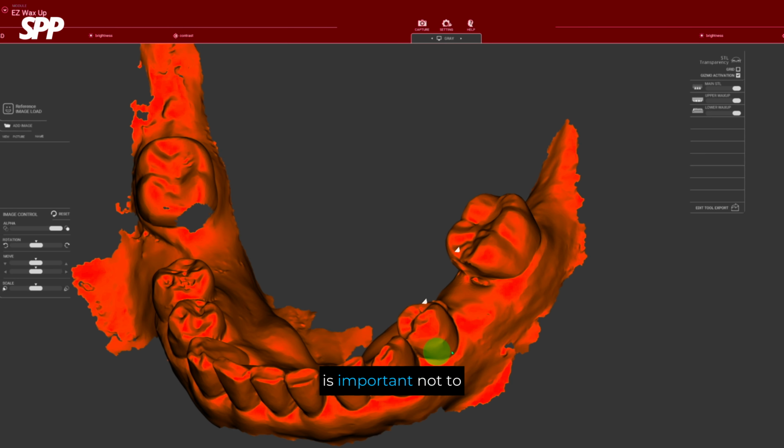Soft tissue appears slightly gray, and air appears black. Using these visual differences helps you adjust and confirm the alignment more accurately. The brown outline represents the STL data. I made a slight adjustment because additional alignment was needed.